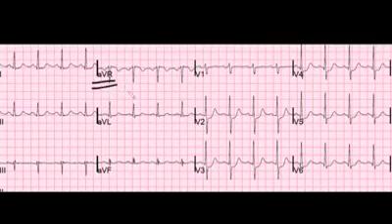In AVR specifically, AVR is a very specific lead, and it's important in that it looks directly at the endocardium. Notice here very carefully that you actually see some ST segment elevation, although it is mild. This ST segment elevation usually means in AVR that myocardial injury is incipient, it's coming. It's an ST elevation MI precursor, if you will. So if you see this ST segment elevation, be very, very concerned.